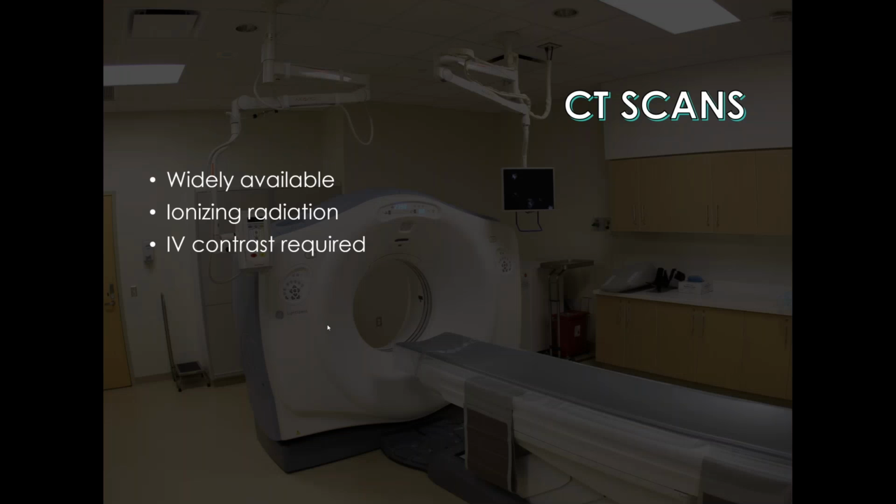Okay, so that's ultrasounds. The big study that would be ordered for neuroendocrine tumor imaging would be CAT scans or CT scans. Now, this is widely available. It's in large centers and small centers now. It does use ionizing radiation, but it's really the bread and butter evaluation for neuroendocrine tumor imaging. The reason being is that sometimes patients will present with abdominal pain or bowel obstruction, and a CT scan is ordered and it picks up the tumor, as well as helps to stage it. And we often give IV contrast for the CAT scan or the CT scan.